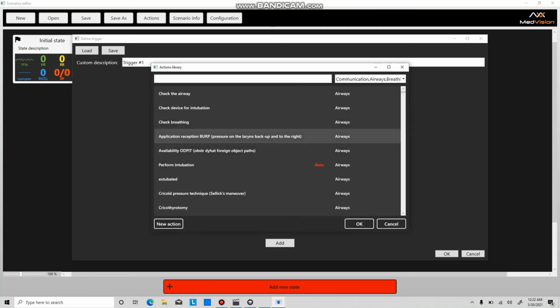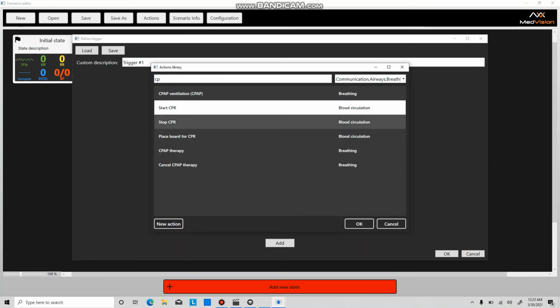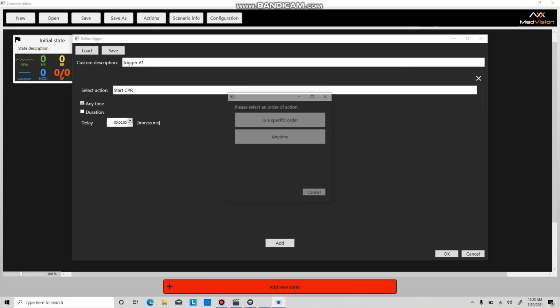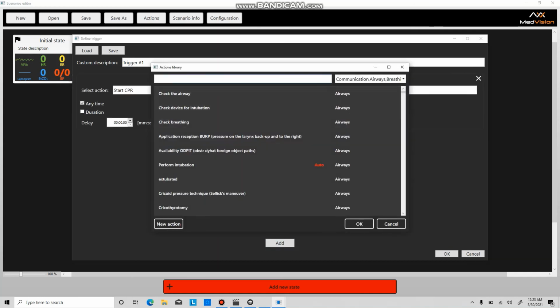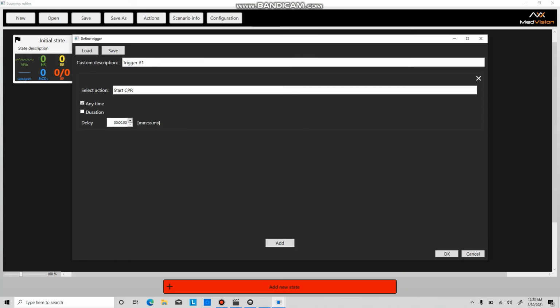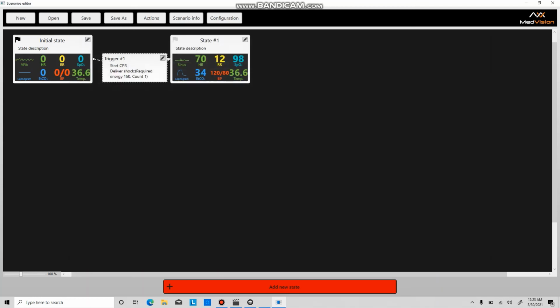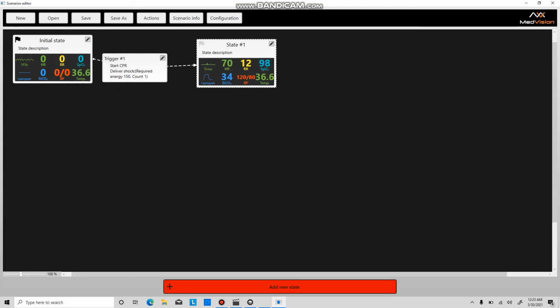So we'll say anytime. So to go from VFib to sinus rhythm, the first things you probably want to do is start CPR. So start CPR, and then perhaps you want to shock. You can just press shock, deliver shock, and then press add there. And then once you added all of the triggers that you want, you press OK. So once the students perform these triggers, the state will automatically go to the next state.